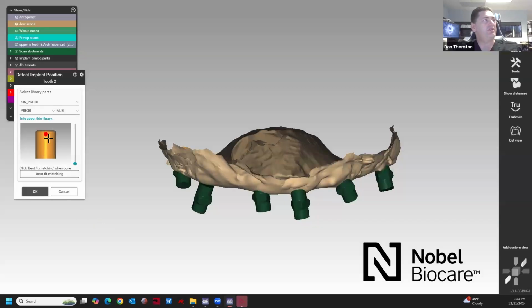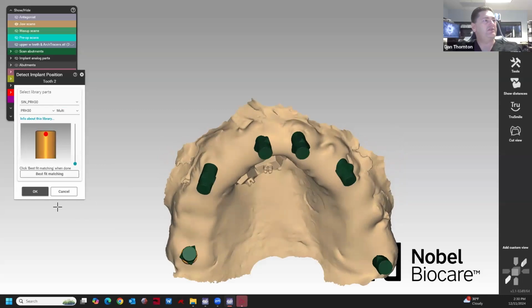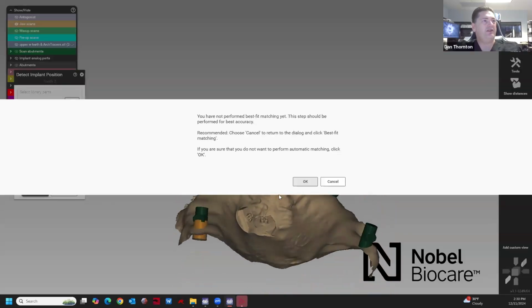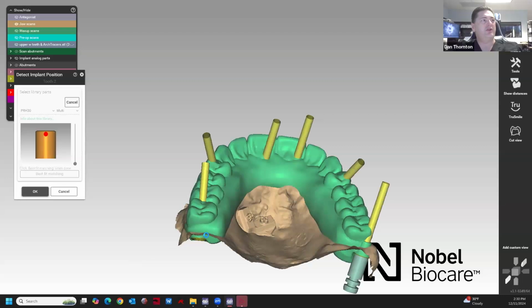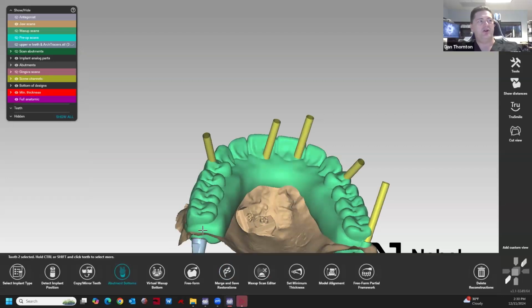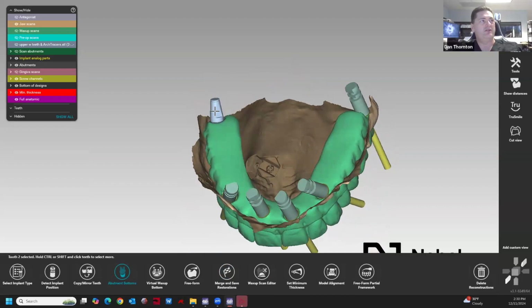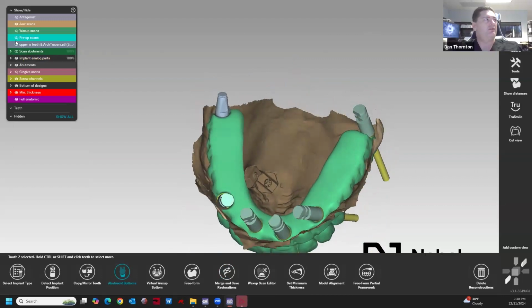As you can see, it just comes up with that library, that scan flag. Click OK. You can see it's there, but you don't have to touch the scan body that you already aligned. And now that is a different photogrammetry. It's a whole different analog, different screw, everything.